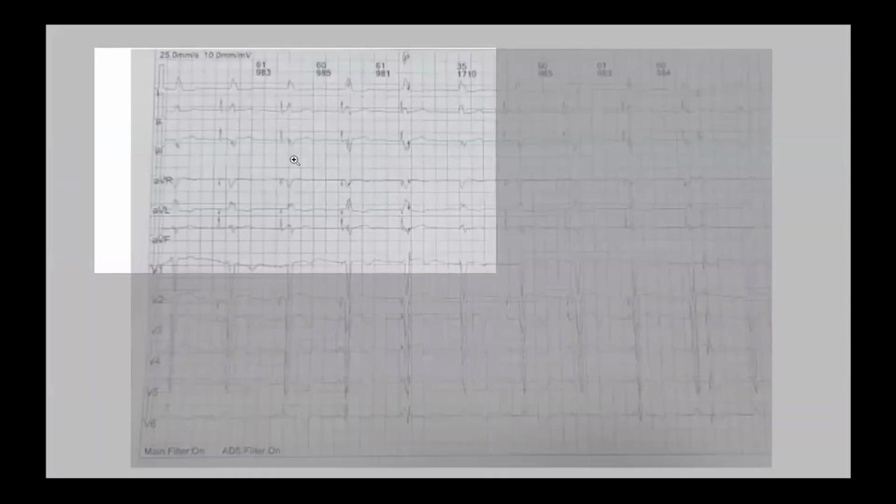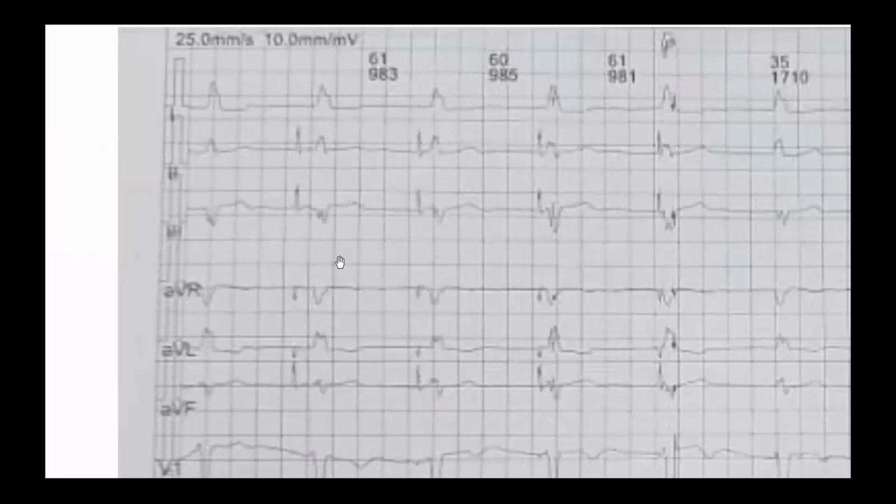What happens here is that the atrial chamber started to fire a spike followed by a P wave. But the junctional escape rhythm is faster than the lower rate of pacing, which is 60. So it looks like there is a P wave and QRS complex simultaneously. How come? Because the junctional rhythm is faster than the lower rate.